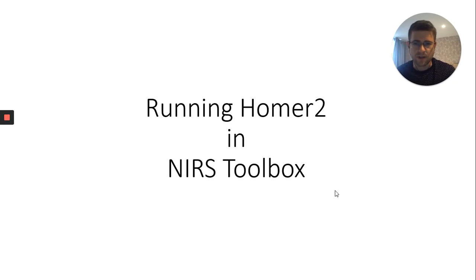Howdy, this is a video on how to run Homer2 scripts in the NIRS Toolbox. Basically, the NIRS Toolbox allows you to manipulate your data in just about any way you want to, and Homer2 allows quite the same functionality as well in many respects, but each one has its own limitations and advantages.